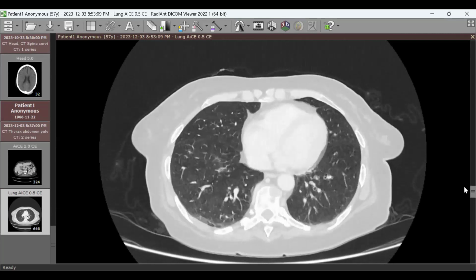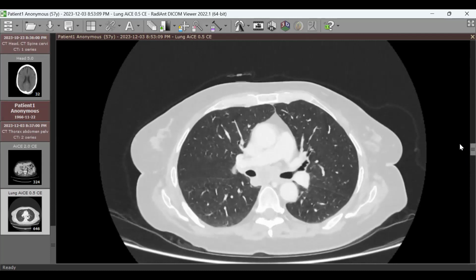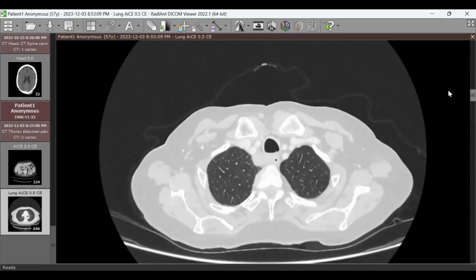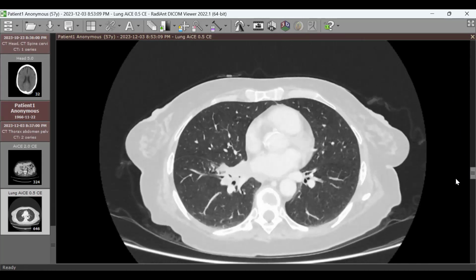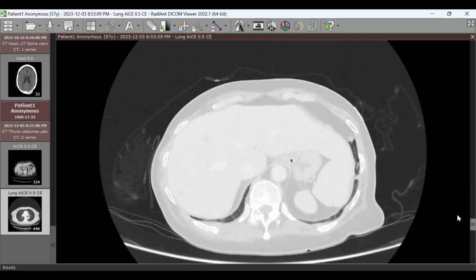So the hypercalcemia was related to the extensive bony metastasis, right? Yes. That's the explanation of hypercalcemia here. And do you see, can you see the main lesion? And tell me where.